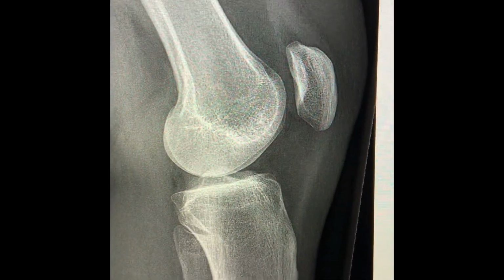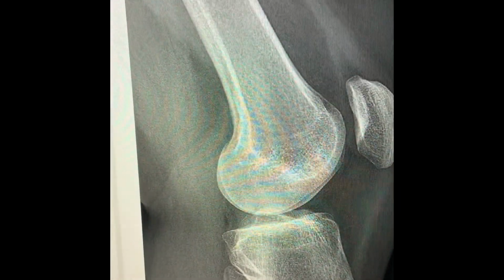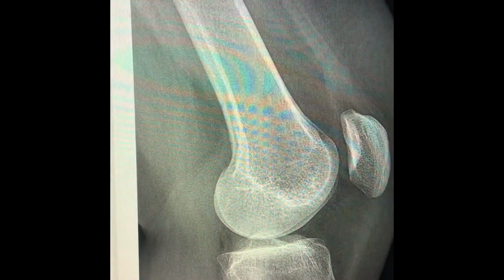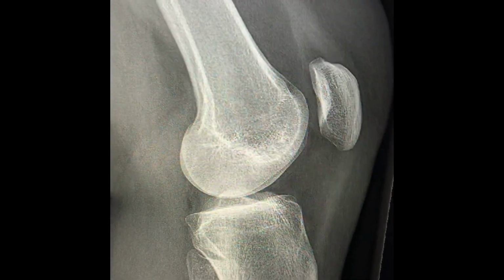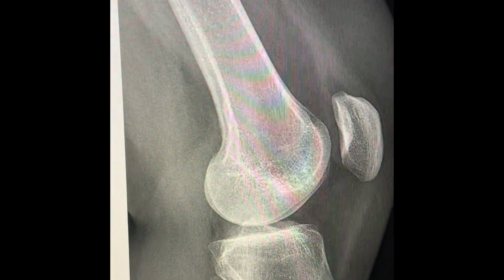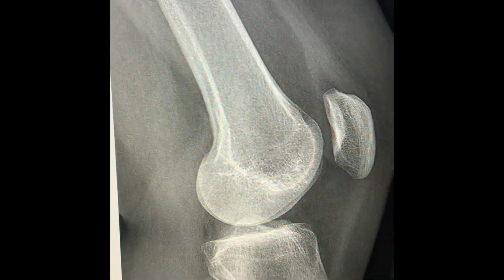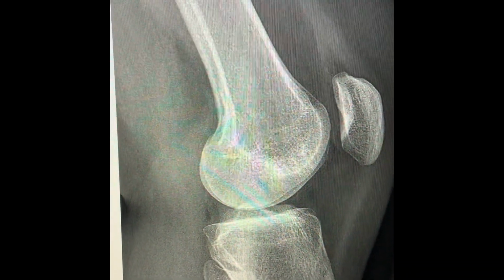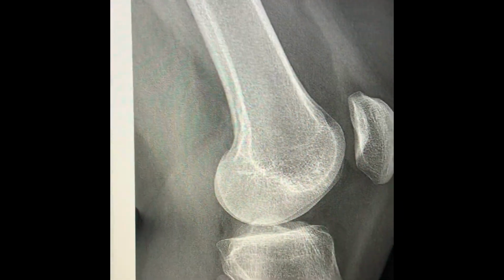The lateral knee projection criteria is the knee needs to be flexed 20 to 30 degrees and the femoral condyles need to be superimposed. The fibular head and the tibia should have slight superimposition. The patella needs to be in the lateral profile. There needs to be open patellofemoral joint space, and there needs to be open joint space between the femoral condyles and the tibia.